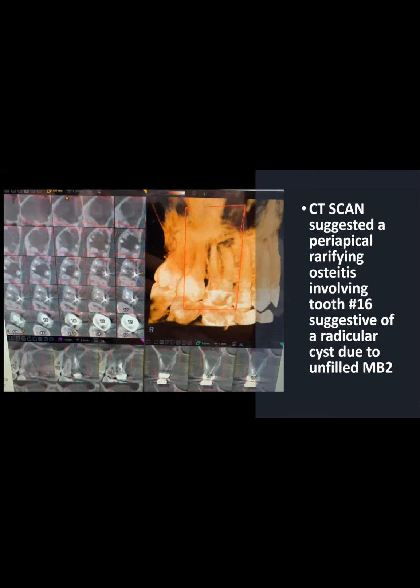Okay, I don't know if she can zoom. I can zoom the pictures. I don't know if you guys can zoom the pictures so you can see it. So here we go, guys. The importance of filling those MB2s, right? According to the radiology report, the radicular cyst is due to the unfilled MB2 canal.